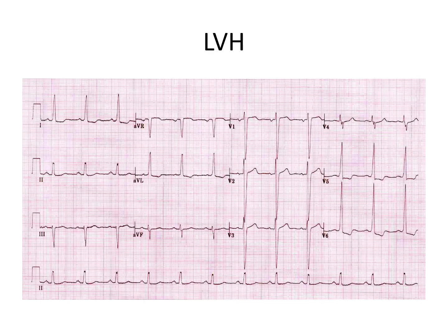And this historically used to be called LVH with strain, but there's actually no strain on the heart going on here. It's just a function that a ventricle has gotten very big and it's taken a good amount of time to depolarize the entire thing. And again, by the time that the outer layers of the ventricle are still depolarizing, the inners are starting to repolarize, leading to QRS to ST discordance.